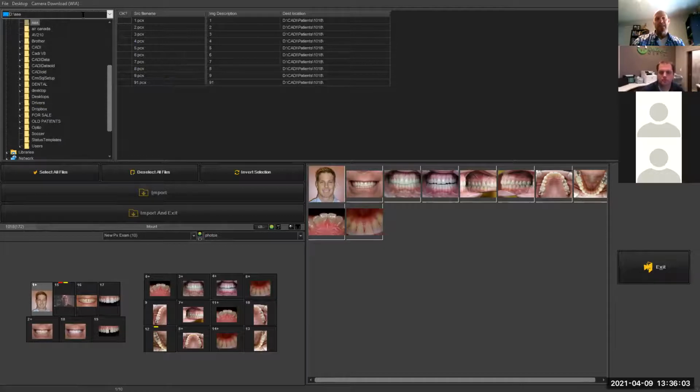And the way we designed this is we actually told the software to delete the camera images off of the card automatically once downloaded. So it creates this sequence, because what happens is after a while you get 80,000 pictures on this card, and then the staff opens it and they can't find the images, or they don't know where the images start and stop for the next patient, and it just becomes confusing as heck.